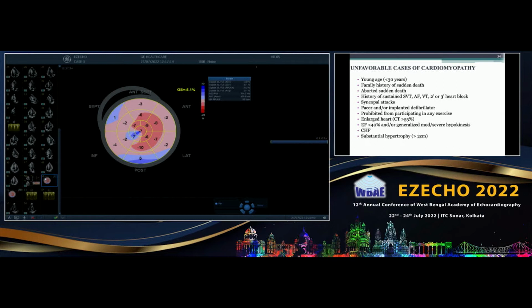And generally, but you know, the interesting part is not in this case. If this kind of picture with a slightly brighter apical thing goes, that is in favor of amyloidosis, you are telling, coexisting amyloid. Yeah, this is Dr. Jamil Tajik's paper. I'll show you a case in the evening, then your answer will be correct. But I think this is a nice case to give your answer, then at that time you will be able to answer this.